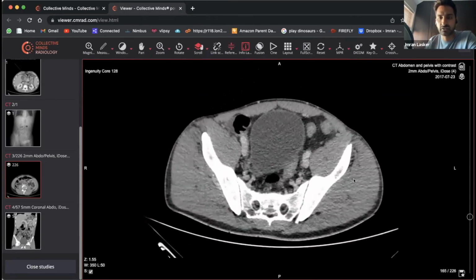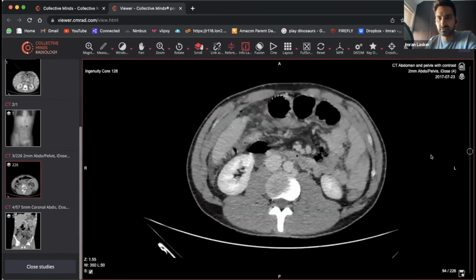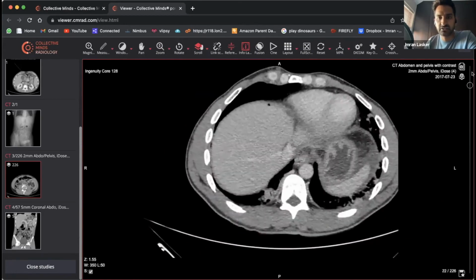if you've got a slightly older patient, they don't have big muscular glutes and abs and all this stuff. So the patient's quite young, clearly. They've got big paraspinal muscle, probably doing a lot of deadlifts and that kind of thing. It's quite a young patient.